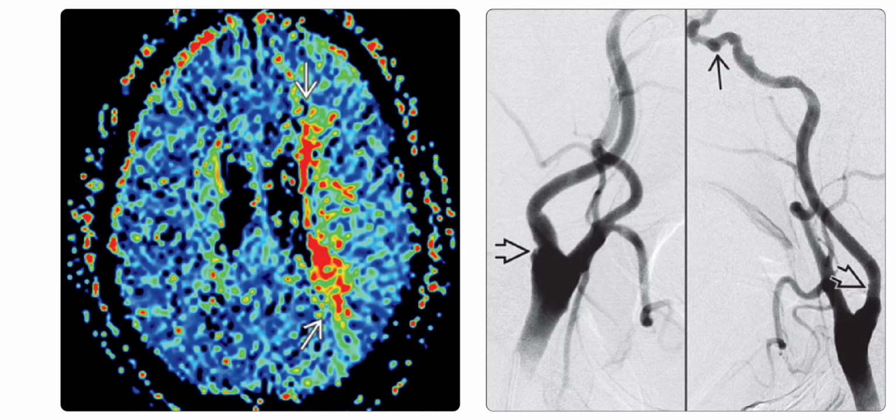So the left is the MR perfusion in the same patient, and it shows no evidence for a major territorial infarct. However, there is prolonged mean transit time in the internal watershed zone of the left hemisphere, deep cerebral white matter. Because the MR perfusion scan suggested deep watershed zone ischemia, a DSA was performed. While there are some minor irregularities of both the proximal internal carotid arteries, no flow limiting stenosis were identified.